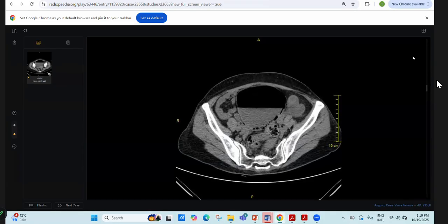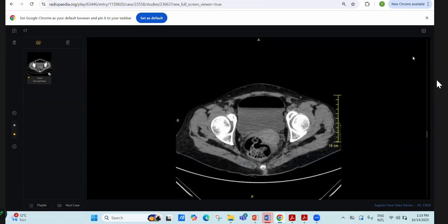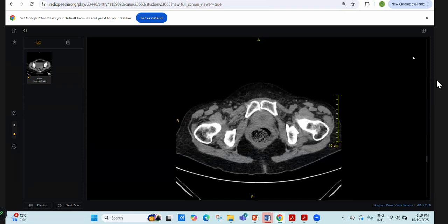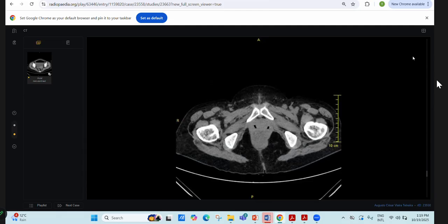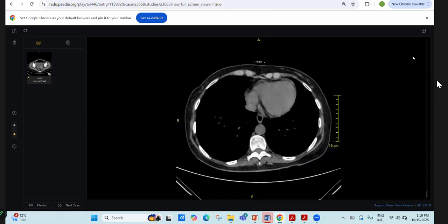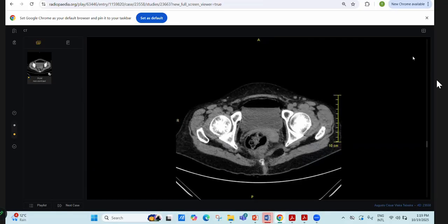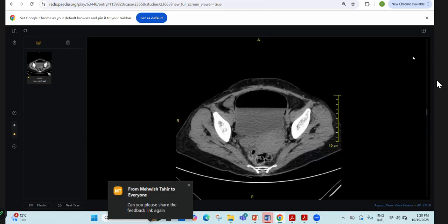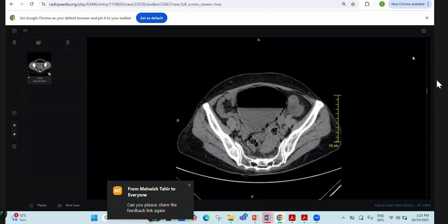So this is likely a severe urinary tract infection in a diabetic patient, leading to emphysematous cystitis. The urethra is also thick-walled. Is there any history of trauma? No. So this is likely infection with gas-producing organisms in a diabetic patient, leading to emphysematous cystitis. I would urgently inform the finding to the referring clinician for immediate start of antibiotic therapy and refer this patient to urology. Okay.